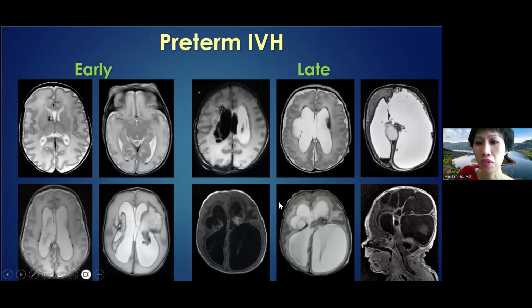And then you can have the dreaded complication, which you see in many preterm infants, of the post-hemorrhagic hydrocephalus. You get all these post-hemorrhagic adhesions and isolation of the ventricles, and it becomes very difficult to manage their hydrocephalus because you have so many different loculations in here.